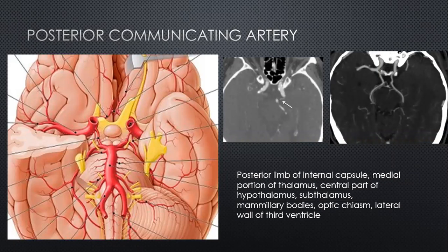The posterior communicating artery, of course, is the big branch which comes off after the ophthalmic artery.